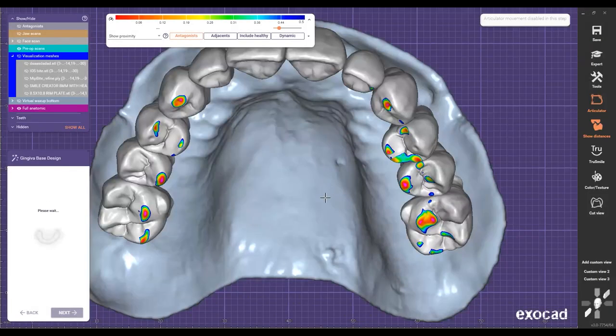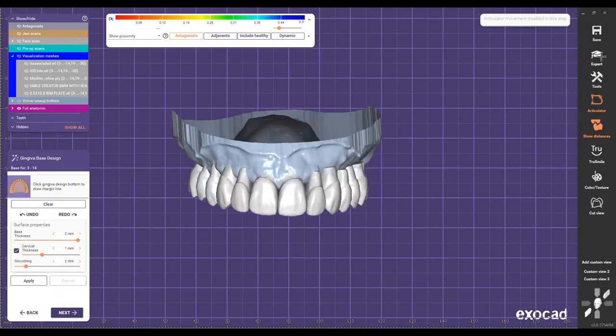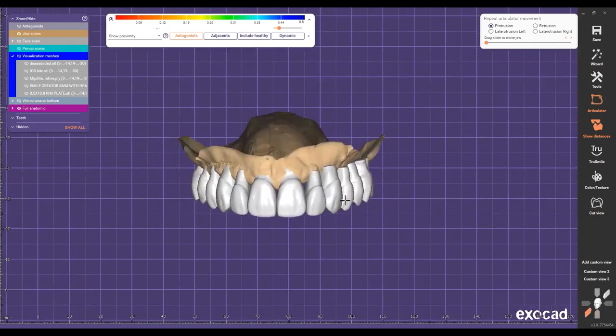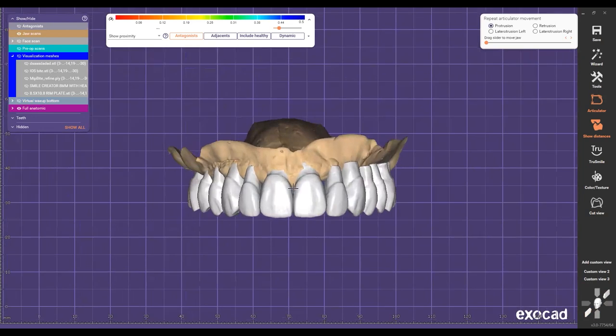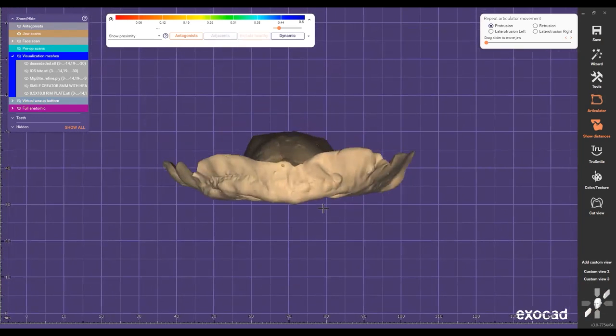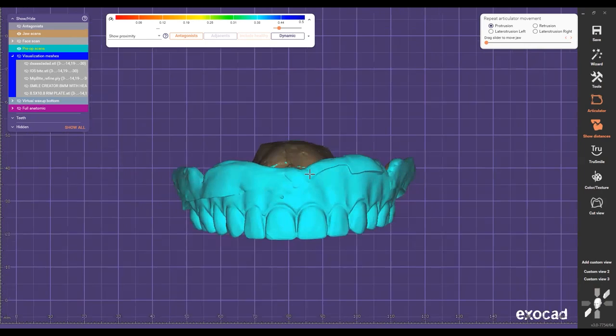So here, right before I do this, I like to know how much bone I'm gonna cut, based on the facial expression. Remember, the Instarisa workflow starts from the face, from the outside to the inside. Okay, we don't start from here, because this is not going to help me.